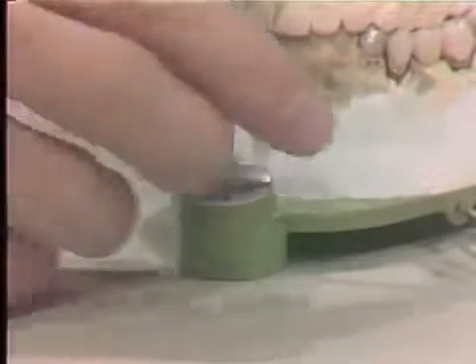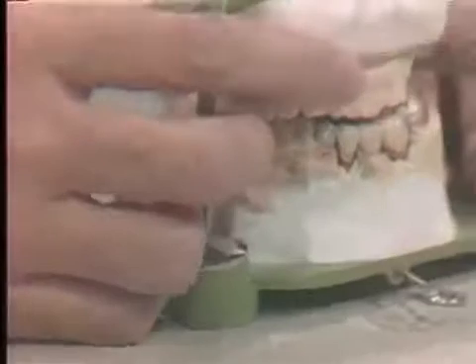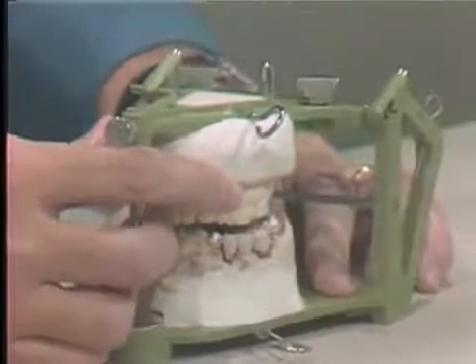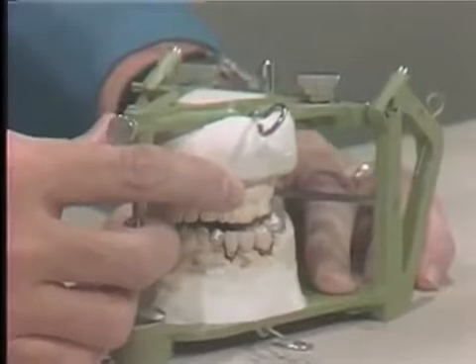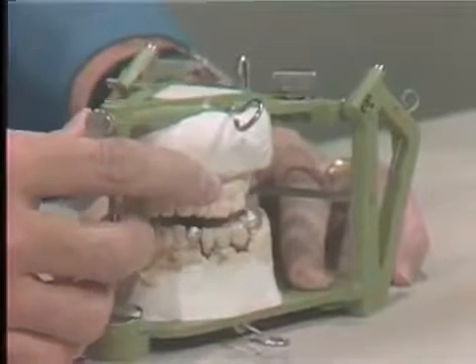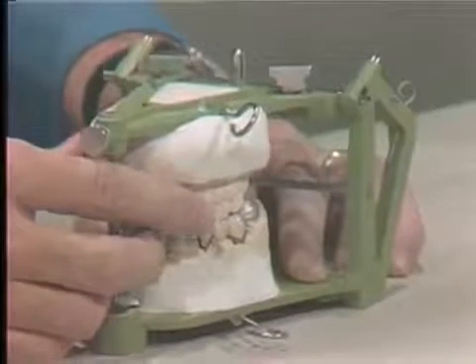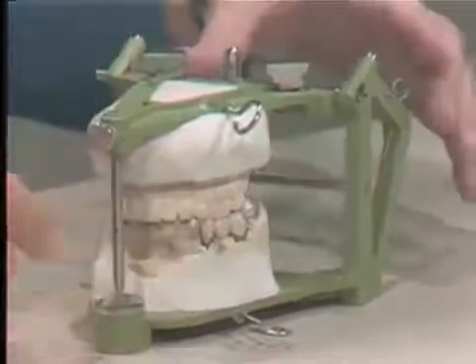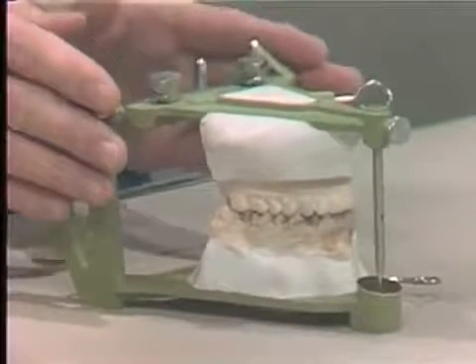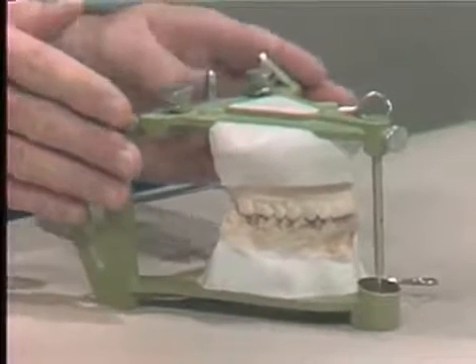These are all averages. They're all set on the articulator. You have some protrusive movement, which means the upper member of the articulator is going to go in a retrusive or posterior direction. But again, this is a set movement. You can't change it on this articulator. And the only advantage perhaps to this articulator is that it more nearly is in the size relationship to the skull.